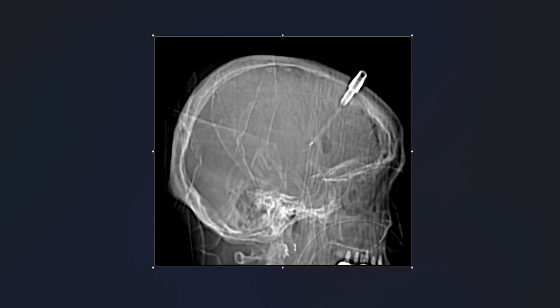And so basically, this device here looks like a frontal approach ventriculostomy device, perhaps a pressure monitor, a little bit hard to tell from a single image, terminating in the area of, I think would be the lateral ventricle, but again, hard to tell. Here we see these oval-shaped lucencies adjacent to there.